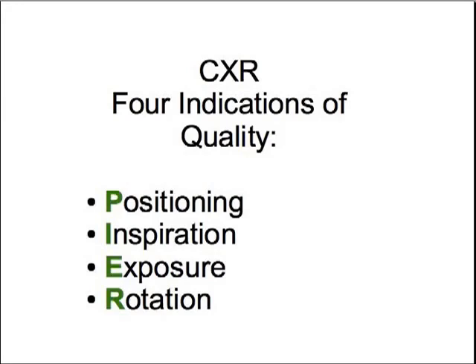Another important topic is whether or not you have a quality chest x-ray. There are 4 indicators of quality. This is important because there are questions on the National Board for Respiratory Care exam about this particular topic. Just think PIER, P-I-E-R: positioning, inspiration, exposure, and rotation. And I'll talk about each of these.